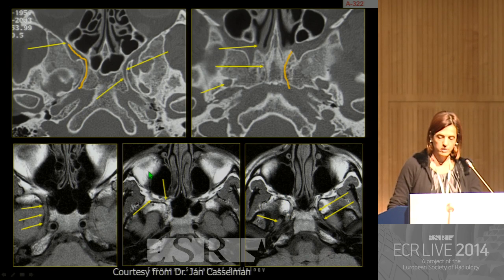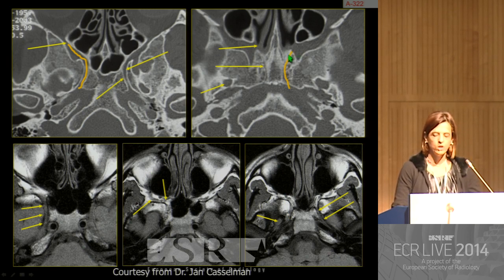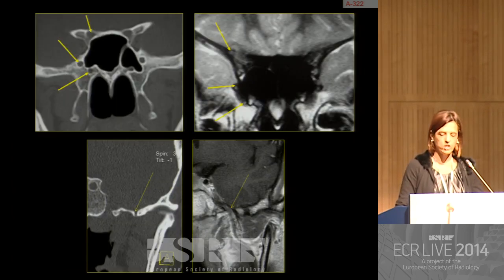If you move a little bit more medially and inferiorly, you will get into another canal, which is the Vidian canal. This canal gives passage to the Vidian nerve, and the Vidian canal has its posterior opening in the region of foramen lacerum, and then extends all the way anteriorly to the high pterygopalatine fossa. Then if you move a little bit more laterally, you have another foramen, which is foramen ovale, and this gives way to the nerve 5-3, or the mandibular division of the trigeminal nerve.